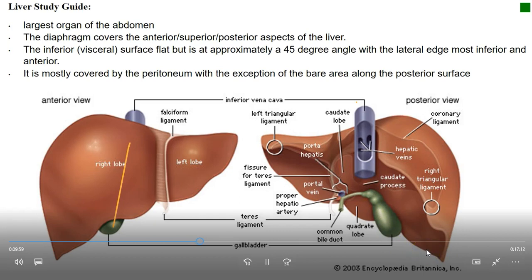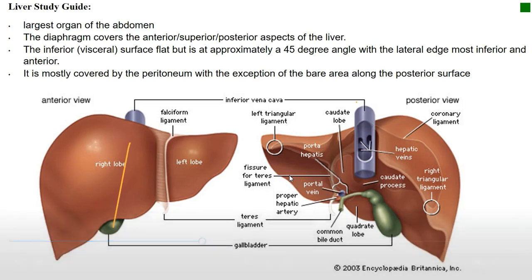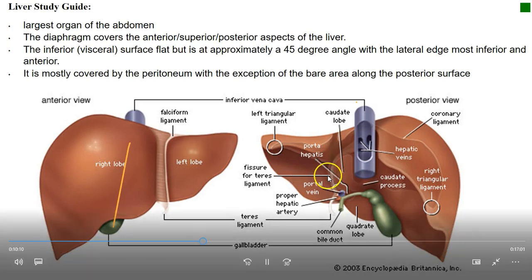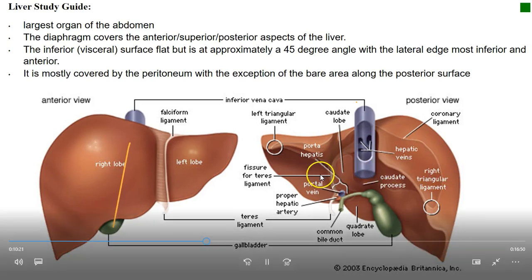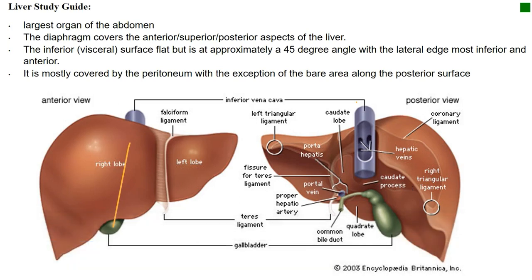So when you're thinking about this in cross-section, you're often going to catch only pieces of the gallbladder or pieces of anatomy. If you think of drawing a thin line across here, and what structures you would get if you just drew a thin line, and what structures you would catch. And then if you made a slightly thicker line, like maybe from here down to where the word portal is, and you go all the way across, you might catch a few more structures there. So each image in a CT scan will show you varying degrees of anatomy depending on how thick the slice is.